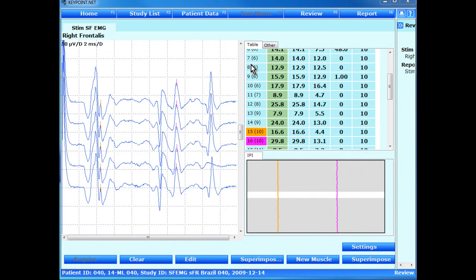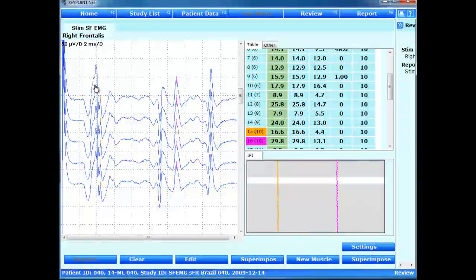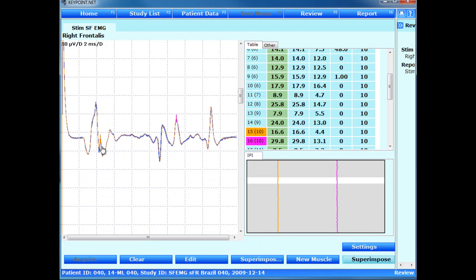And the last example here is a very complex recording where the operator had discarded the first one because it's obviously not clean, but this component down here is constant in shape and very clean all the time. This is not good at all. And what about this one? Well, it shows a few situations of blocking, like here, and at the same time there is an increased jitter. This is suggested by the operator to be subliminal stimulation.